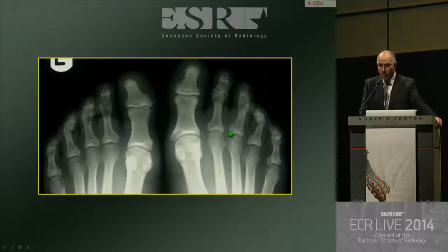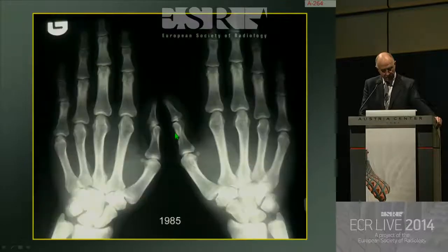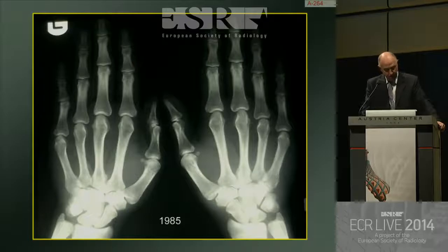And you have to look carefully to make this interpretation, because you can easily suggest that these are subungual exostoses here, but they're in fact not. They're the proliferative phase of the reaction that takes place. And I'm going to show you this wonderful case. Please focus on just the thumbs. Forget what's happening everywhere else.